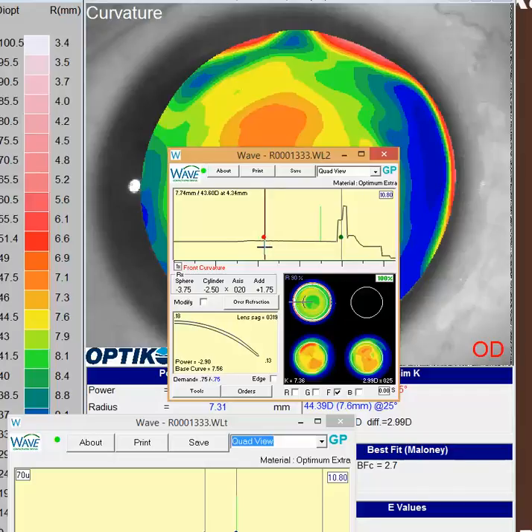So even though we think that the pupil is set at 4.3, we usually actually start infringing a little bit on that pupil area just before that. So sometimes I like to look at this and kind of get a general sense of the power change, and you'll actually notice too if you go further out, you don't really get your full add power until you start getting quite a bit further out there. So those are some thoughts.